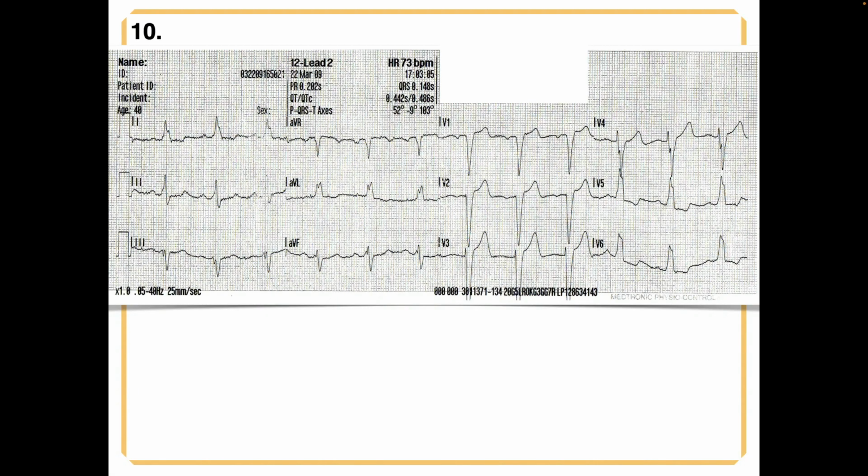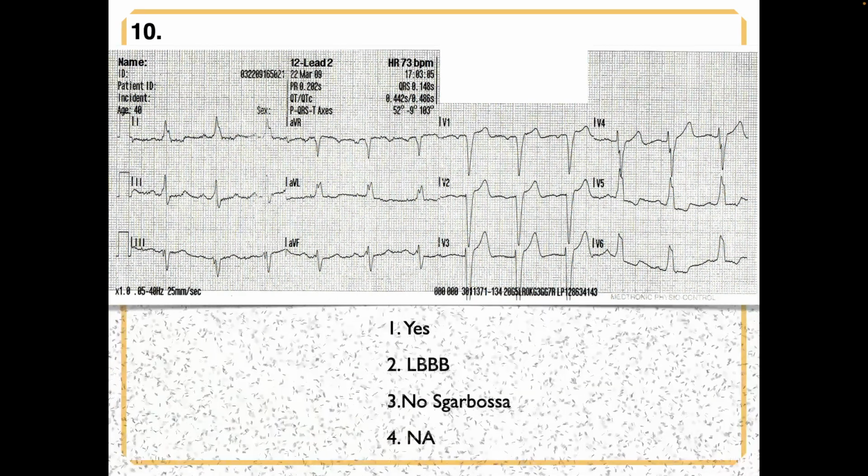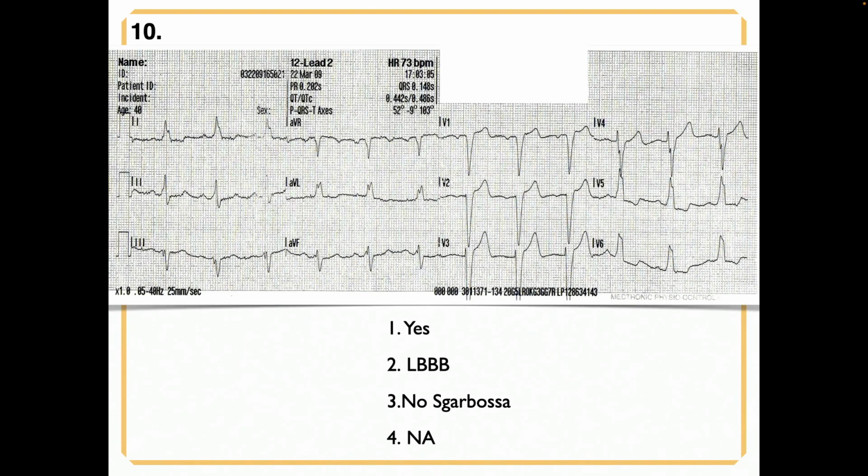Okay, no, we're good. The only reason I said that is this is the exact one where people start talking about this being ST elevation here, and that's perfect that you didn't see it, because it's not there. And in fact, this is the one where I have the line, so you can see if you think, oh, is that ST elevation? No, see how it lines up with the QRS, and so that's just RR prime. Okay.